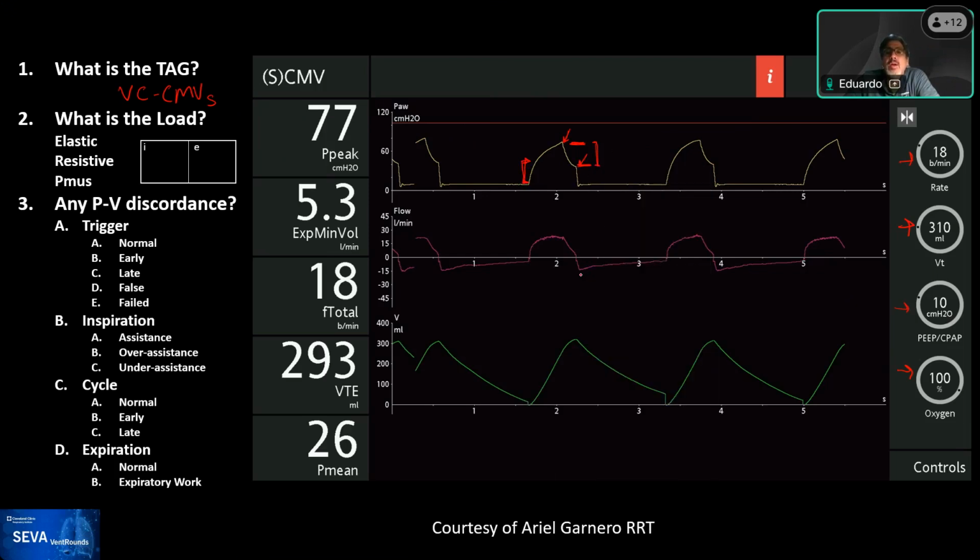But then if you look at the expiratory waveform, the expiratory waveform takes an amount of time, actually it never reaches baseline. And the peak expiratory flow is blunted. You actually don't see any peak expiratory flow there. And those are markers that suggest a prolonged time constant.